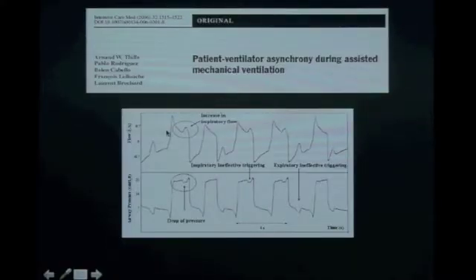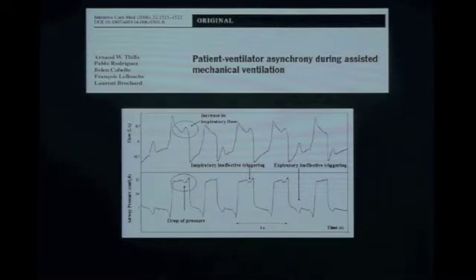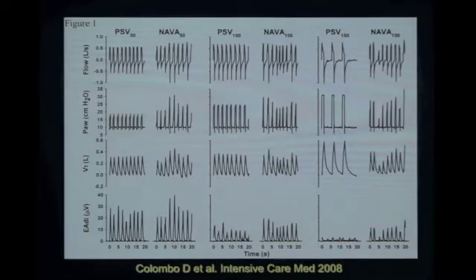The point is that these software work mostly on the expiratory phase of the breath. But as shown by Arnaud Thille, asynchronies can occur whenever in the course of breathing. So in this case, you see, there is an effort that is at the top of the support provided by the ventilator. And at the time we made this study, we found that in some cases it was not easy to recognize asynchronies. Look at this case, for instance.